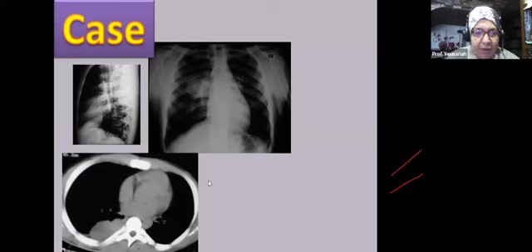The CT actually was very misleading. It showed a wide pleural base lesion with no signs of aggressiveness whatsoever. And actually, it is not a mass. It looks like a pleural base lesion in the right gutter, right posterior gutter, paraspinal gutter.